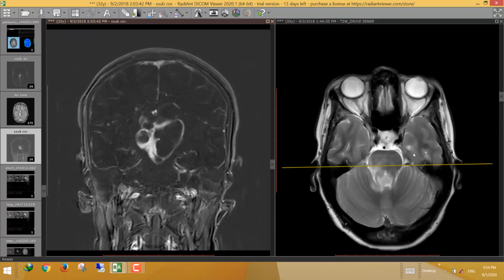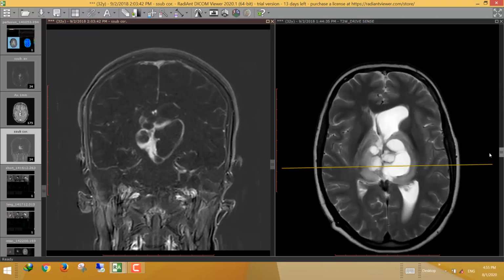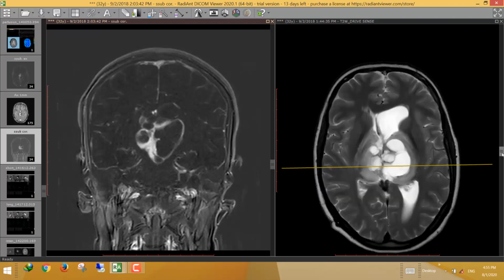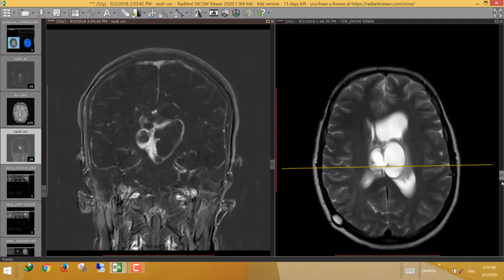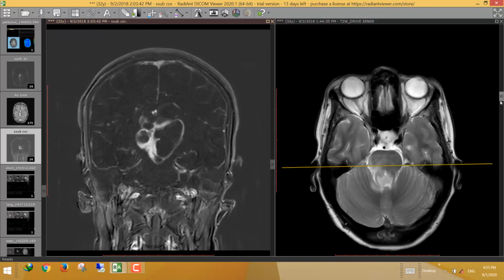This is to some extent a rare appearance, to extend to the inferior ventricles, but it is mentioned in some textbooks that these lesions can extend to the third and even to the fourth ventricle. The lesion is seen displacing the surrounding structures, the thalami and basal ganglia, and even the brainstem, which exhibit high T2 and FLAIR signal.